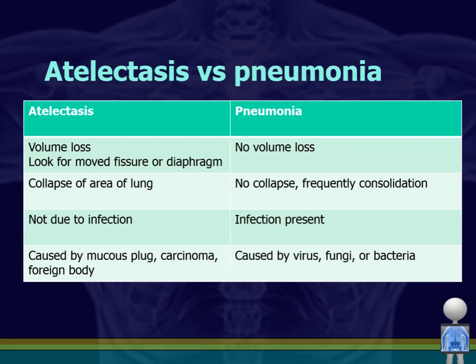So what is atelectasis? Atelectasis is when your lung tissue actually gets stuck together, because that part of the lung, usually the lower parts, but not always, can be upper just as much, depending on what the pathology is, like mucus plugs, etc. But that area of the lung is not being expanded as much as it should be, or ventilated, depending on what we're talking about, and therefore everything gets stuck together. So in this case, volume loss is a key to atelectasis and large atelectasis.